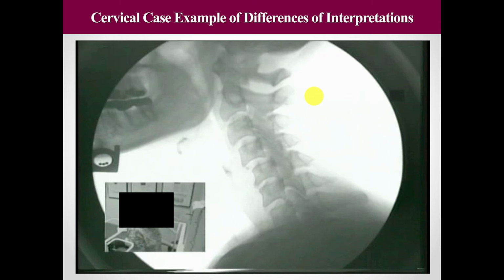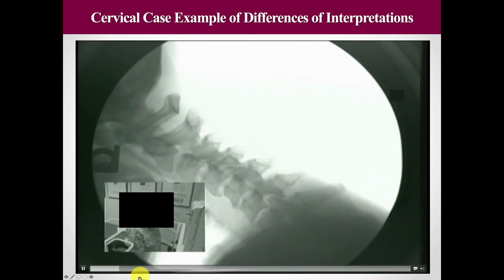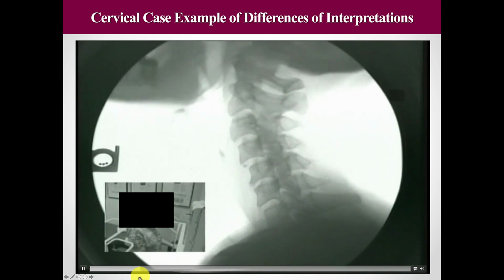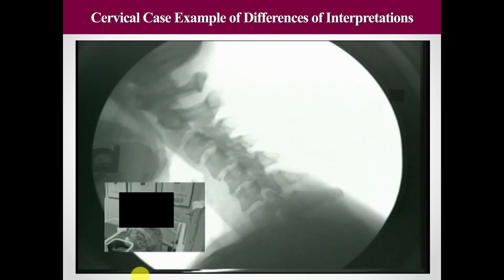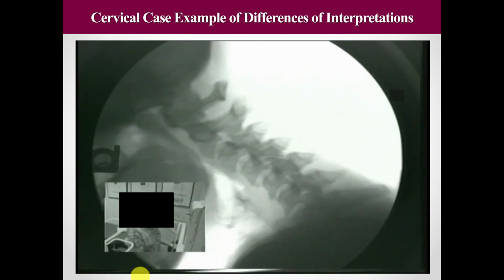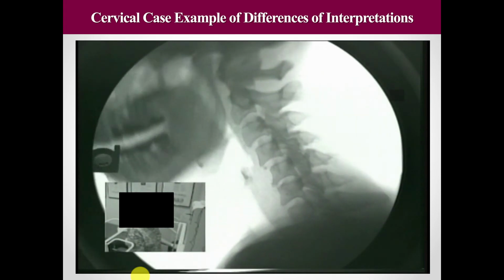All right, so the guides in the 5th edition is going to say, hey, there's no problem here, right? Because they're going to say that spondy isn't moving all that much. So since it's not moving all that much, then we're not going to classify this as a significant problem.